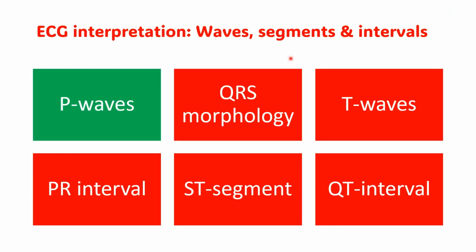Like I said, today we're going to be focusing on P-wave interpretation. In future videos, we're going to be looking at QRS morphology, T-waves, intervals, particularly the PR interval, the ST segments, and also the QT intervals. But let's focus on the P-waves today.